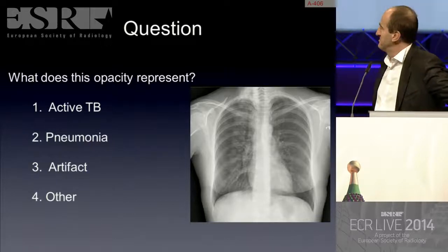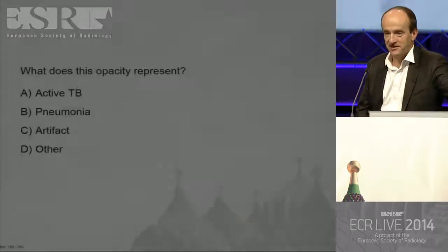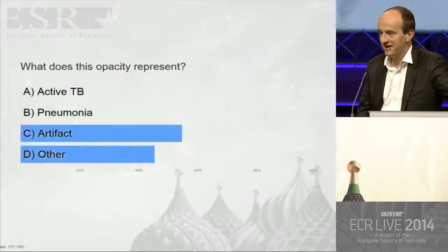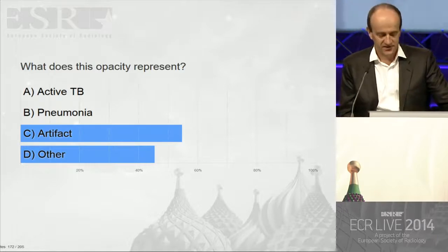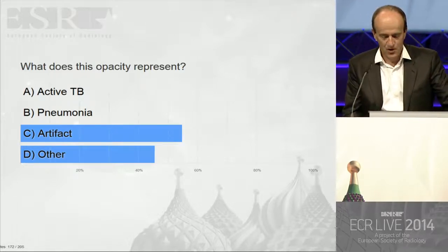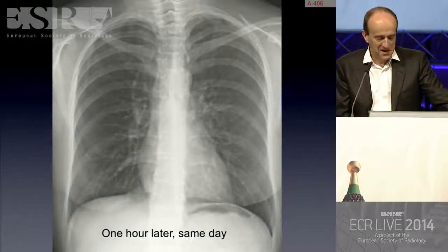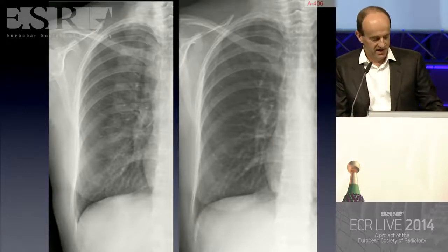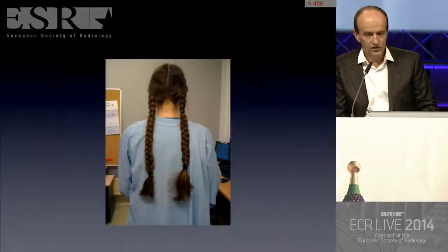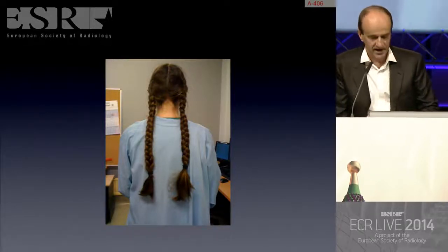Let's have a look. You can still vote. Okay? Both of you are right. It's not really an artifact, but it's something else. 1 hour later, we perform the radiograph again. Here is the comparison. And of course, you can recognize this fantastic and beautiful hair braid.